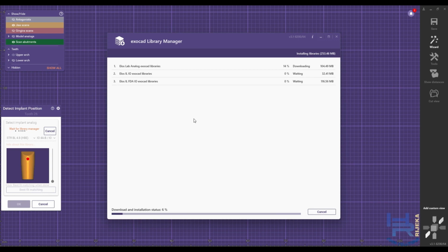But what these options will deal with is installing over top of existing libraries, replacing existing libraries, only updating portions of those libraries. This is a bit of an important step to avoid conflicts and to avoid a messy library structure where you may end up with a mix of old and new libraries. My recommendation for everyone as a foolproof option is to always click on the overwrite option.